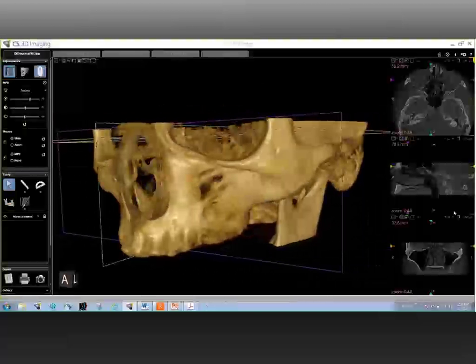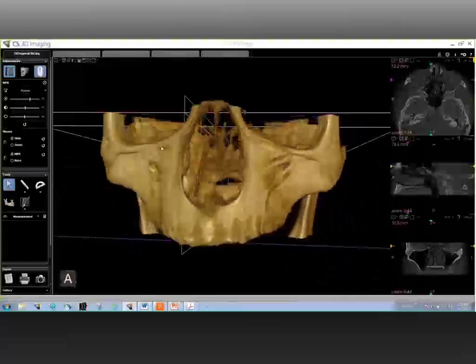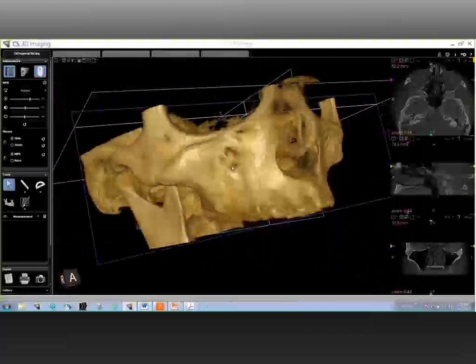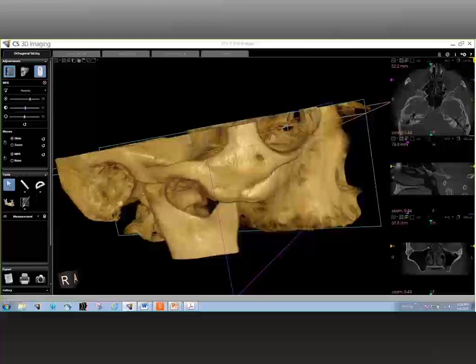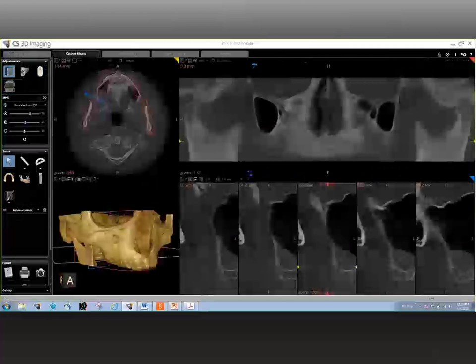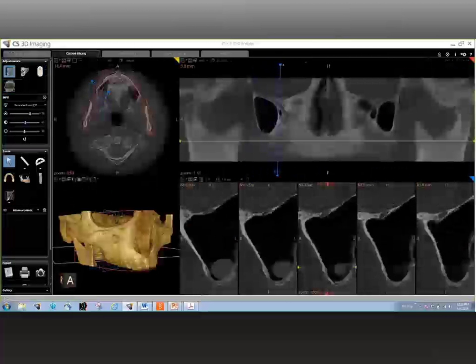What are the most commonly visualized anatomical structures in the maxillary region? Well, Jordan, that is a fairly simple question if you think about it. As with any other hard tissue, one of the most commonly visualized anatomical landmarks is the cortical bone, and by the cortical bone, we are looking at the integrity of the cortical bone as such.